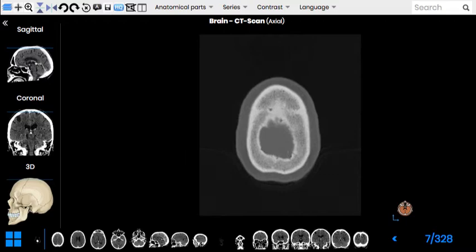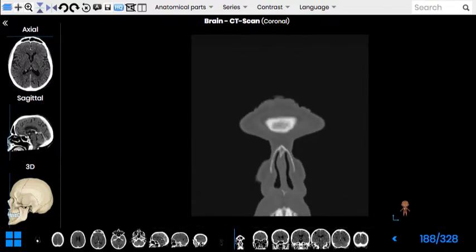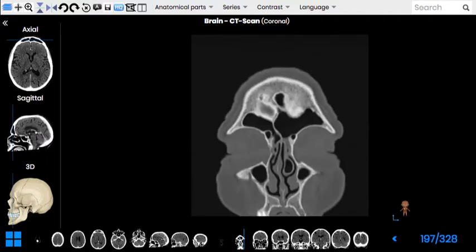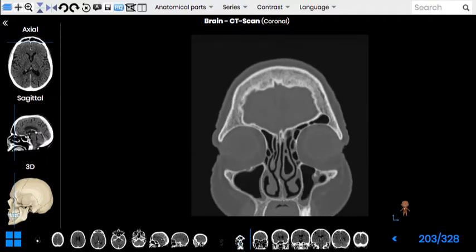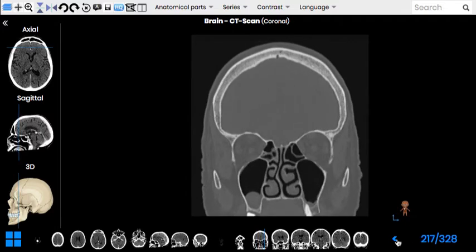from the different angles. Which angles do I mean? Of course I mean the anatomical planes, because all our images are usually taken in three basic anatomical planes. The coronal plane, which is this one, when the computer cuts the body from anterior to posterior direction, and we can scroll through them and evaluate pathologies.